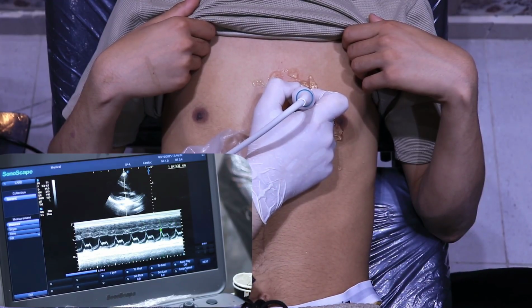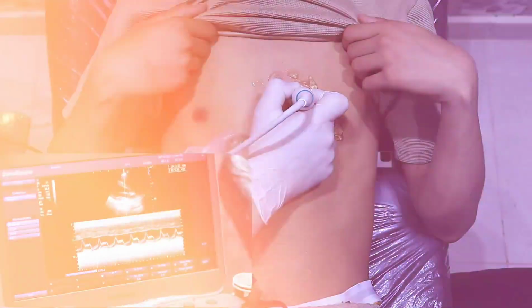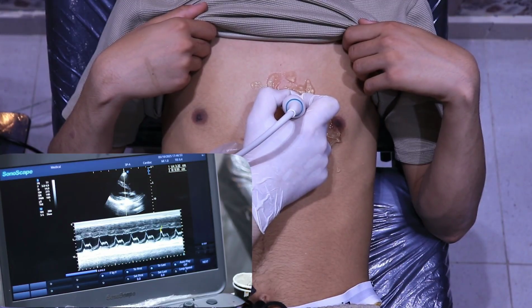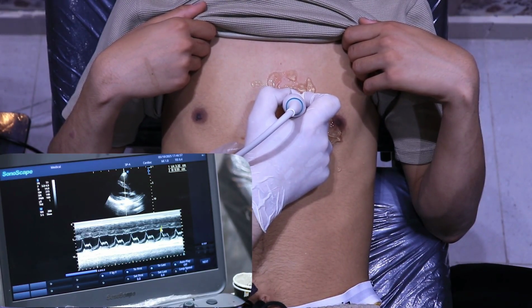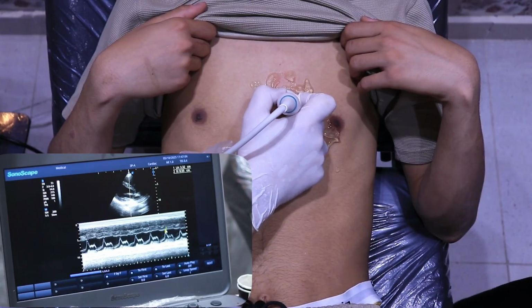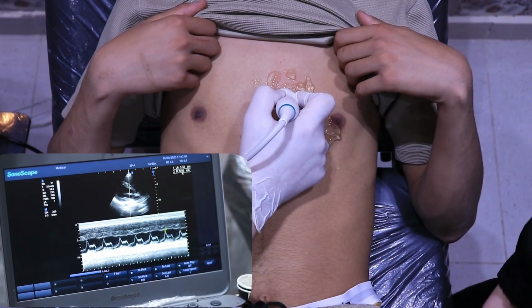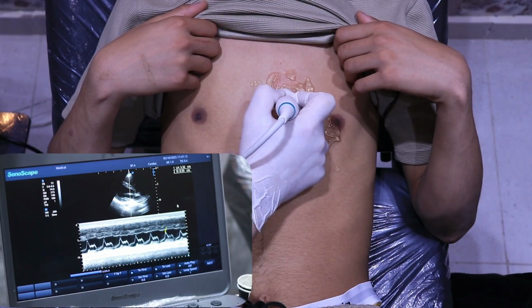Let's take this, for example, here. This is the E, this is the peak of the E, right? And the septum here. You can see here the E point, right? So the distance between the E point and the septum should be less than 6 millimeters, right? Of course, because this means that the valve is opening very well. So it has to be less than 6 millimeters. Here the distance shows 0.5, which means 5 millimeters. So this is completely normal, right?